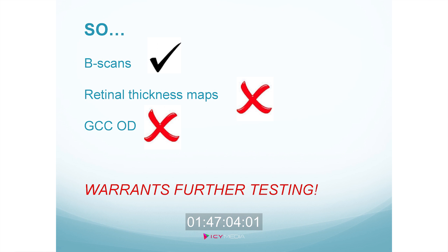Okay, so the B scans are normal. The retinal thickness map showed an area of thinning superior, and that ganglion cell map was clearly outside of normal limits. So what do we do? We need to do more testing. The patient's symptomatic, we're picking up on something, we need to get more testing.